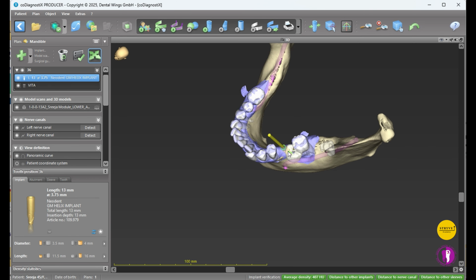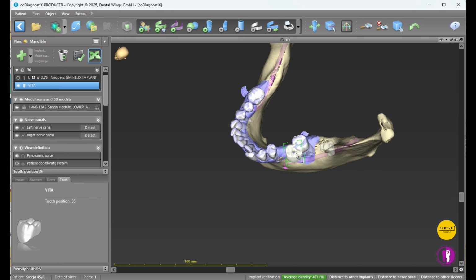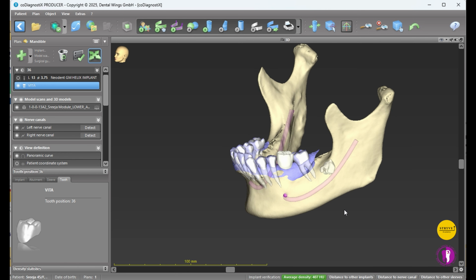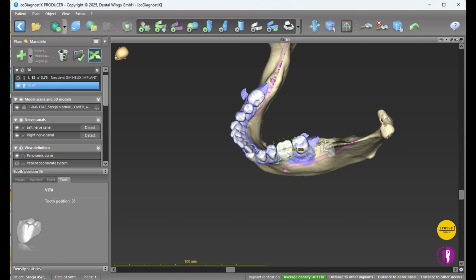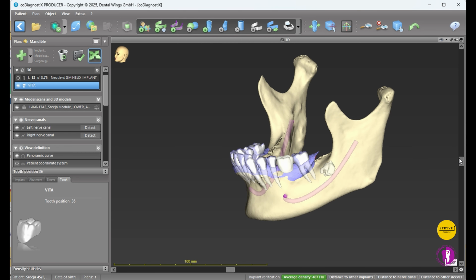So which is aligned now? The teeth are aligned, and now whichever is selected will show. I am going to select only the tooth. Just place it there, okay, and you can adjust it so that it fits exactly in the place, like how you are doing a tooth setup. Instead of doing the tooth setup in front of the burner and the flame, what we are doing is setting up here.